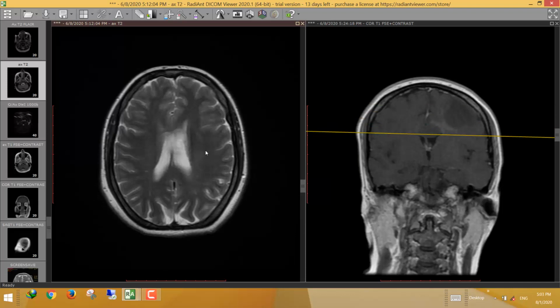Again, a point of differentiation between tumefactive MS and lymphoma is the diffusion, but here the diffusion is corrupted and missing. So we can depend only on the post-contrast enhancement. In lymphoma, the diffusion shows diffusion restriction, while in tumefactive MS it is usually free diffusion.